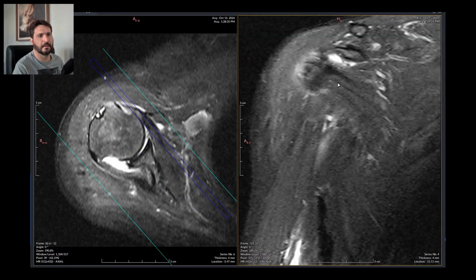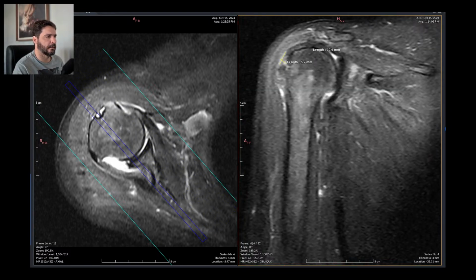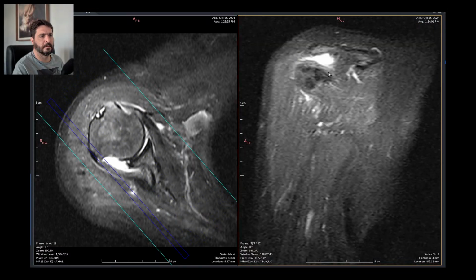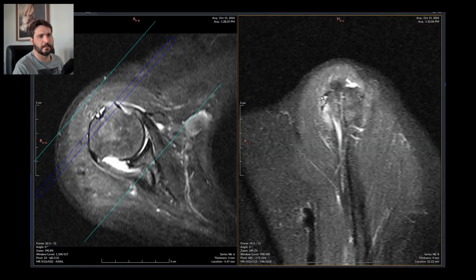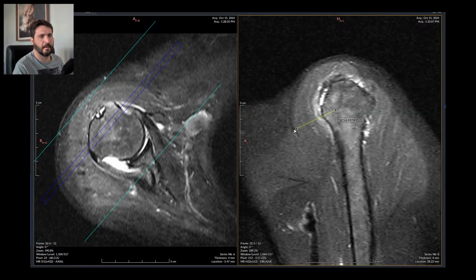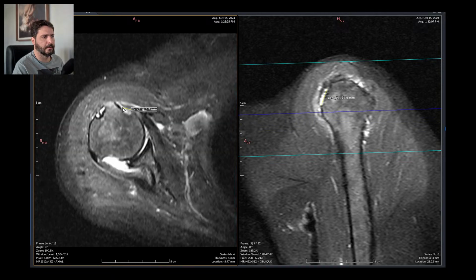No, of course not, because this scan sucks. Whatever. Let's see. Yeah, it's a goner. I've just measured this and this and maybe this.